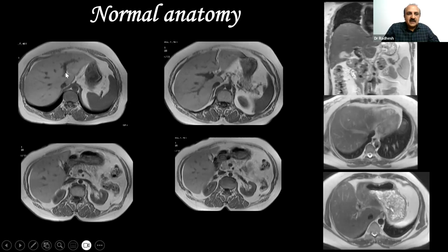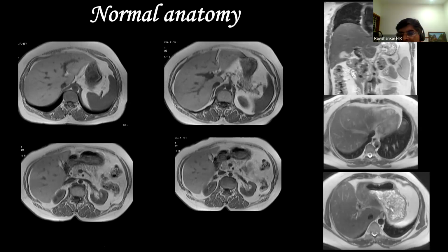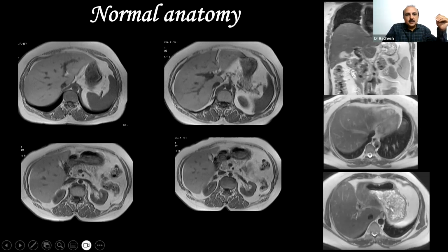So now within the liver, you see this branch here. Now, the segmental anatomy also becomes very clear when you go from, say, top to bottom, or the superior surface, diaphragmatic surface of the liver. Then you go down to the segment 6. So superiorly, you have segments 8 and 7. Then posteriorly, you have 6 and 7. Then superiorly on the left, you have segment 2. Then 3. So now you have the gallbladder fossa also, where you have segment 4.